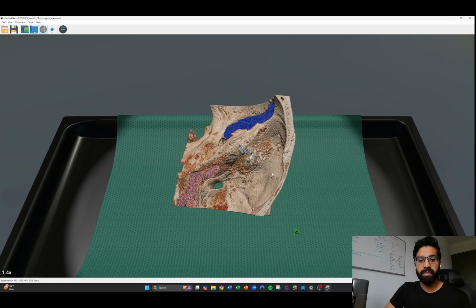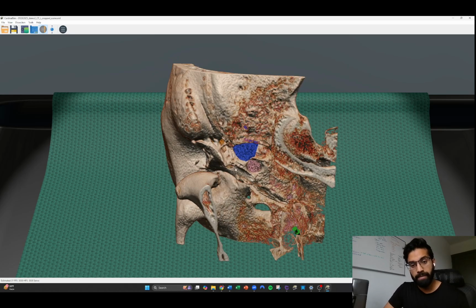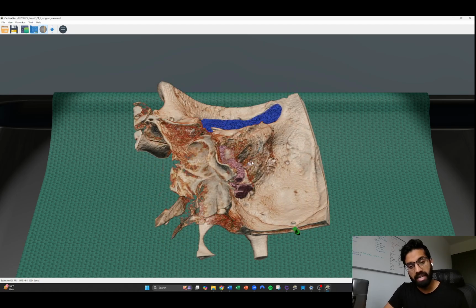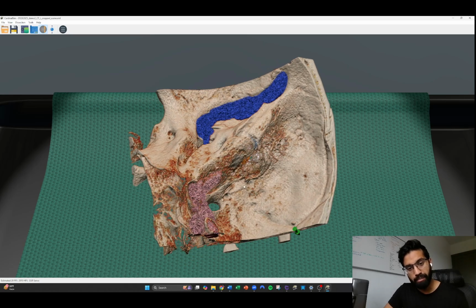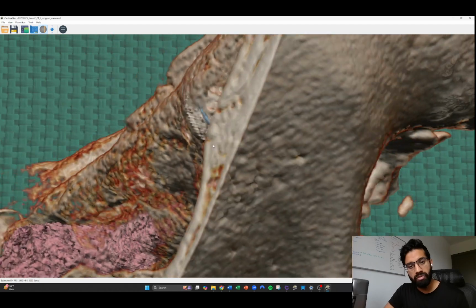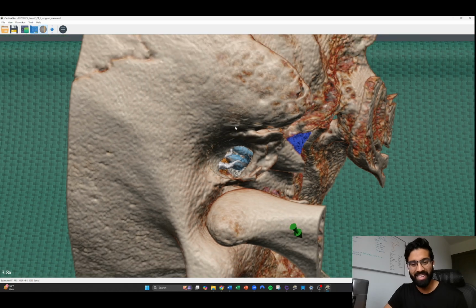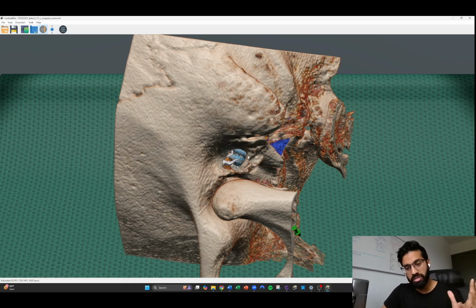So we see this has popped up. This is the exact same scan, just rendered in 3D. You see those color-coded sections have all been identified here. Now, some of them you can't see because they're hidden within other pieces of bone. But there's a number of them, and you even see some deep inside the structure there. You can see the way it's moving. This is not a surface volume. It's a fully volumetric rendering of this specific patient's anatomy as derived from their CT scan.